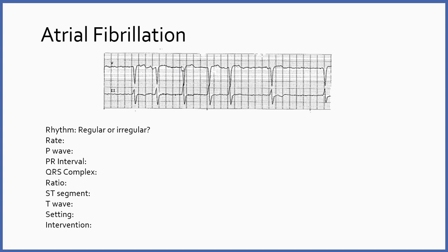Remember, QT encompasses the QRS, ST segment, and all the way to the end of the T wave. And so I'm looking at that, and I come up with 0.36 seconds. It's almost, but not quite 2 big boxes, okay? So the QT interval looks okay.